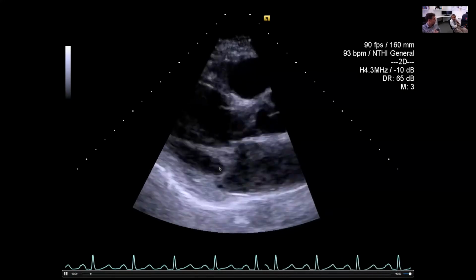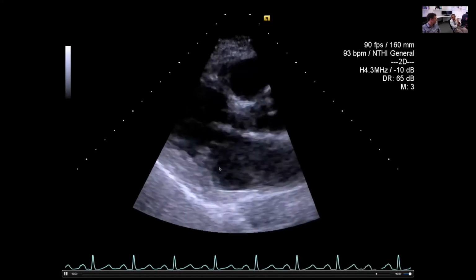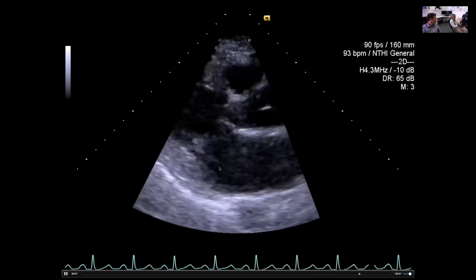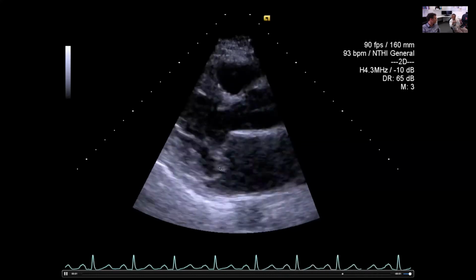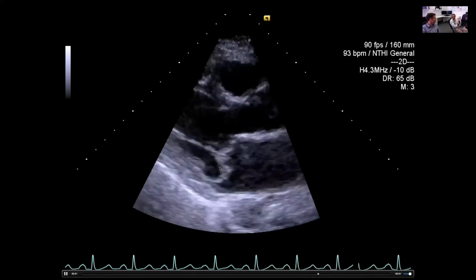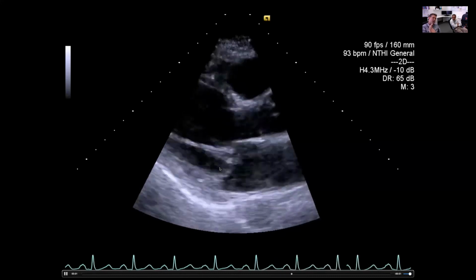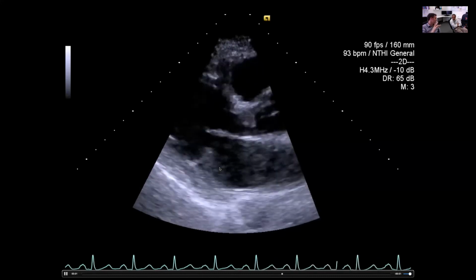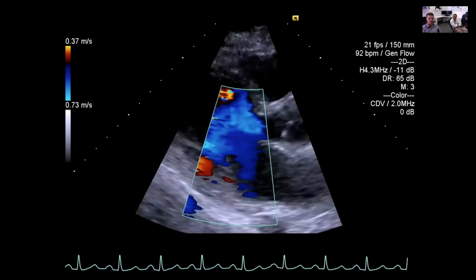How do you tell the difference between a prolapse and a flail? So it depends on the whole segment, whether the whole leaflet is having the cusp shape, like a concave shape during systole, or it's just the tip. Nice. So I read that if the end of the leaflet is pointing towards the left ventricle, it's prolapse, and pointing towards the left atrium, it's flail. Yeah.